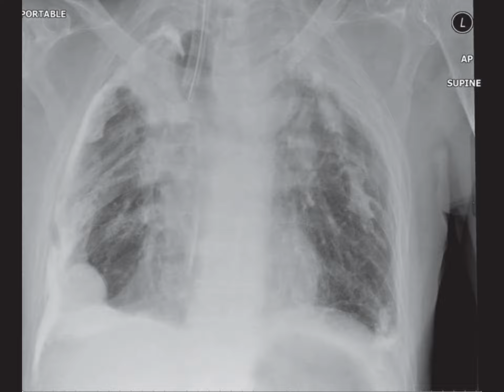The bones appear normal. Many of these findings likely represent a long-standing process, possibly related to a past history of tuberculosis. Given the extensive calcification and fibrotic changes, understanding the patient's clinical history and reviewing any previous imaging would be beneficial. It's important to determine if there has been any progression of these fibrotic changes or new consolidation.